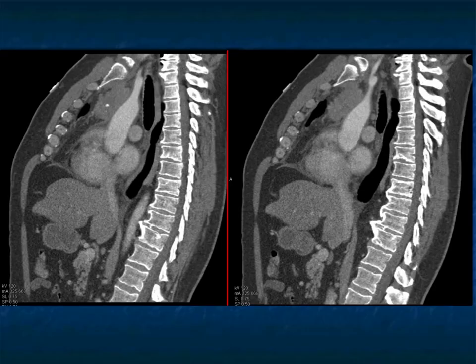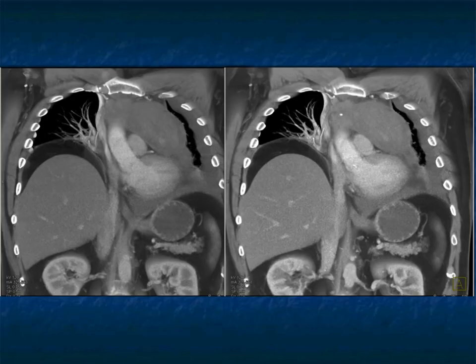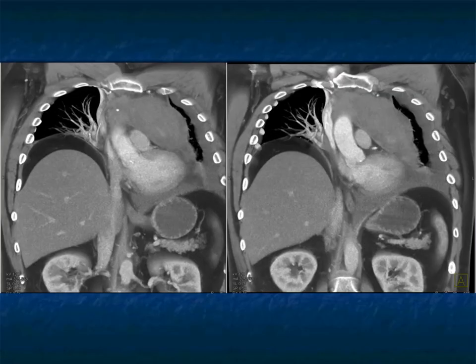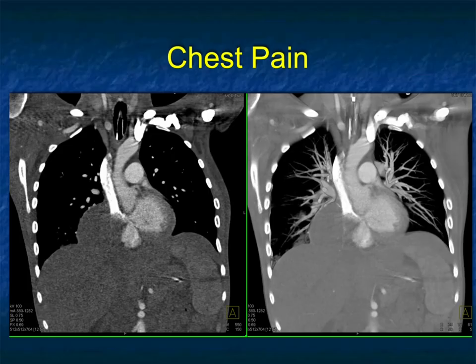Very nicely shown. Here's a few more images. And here's the sagittal view. This case, on the sagittal, you see the punctate calcification. And I mentioned before, thymomas can indeed calcify, but you don't have really coarse calcifications. Coarse calcifications, anterior mediastinal mass, I got to think about lymphoma that got radiation therapy, but also think about teratoma, and we'll come to that. But just a really nice example showing you some of the 3D images of the extension of this patient's thymoma and its infiltration. And again, this has all the hallmarks of a malignant thymoma.